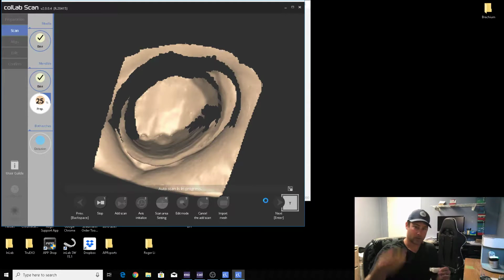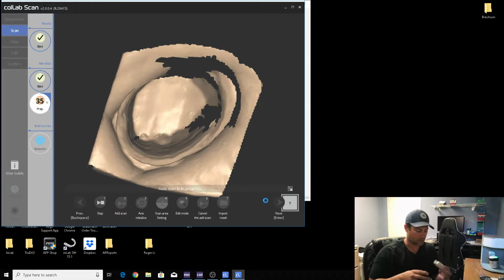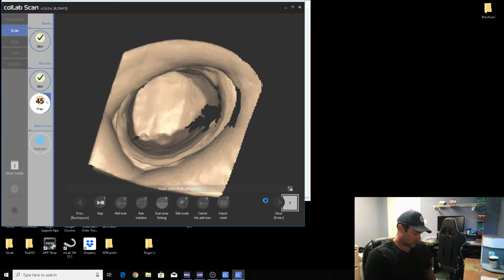Got it in. I use a rubber band to hold these down together. This is a rather large rubber band, so I gotta wrap it around a couple times. Go ahead and get it clamped down. There. Good to go.